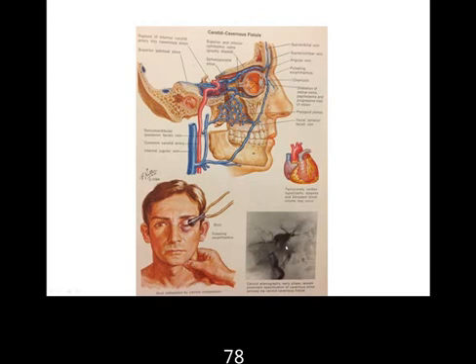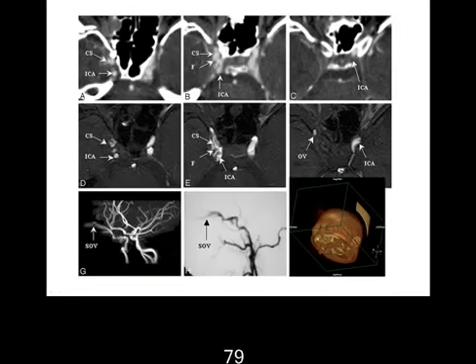And then this is an angiogram where we later put a coil in there and stopped the arterial blood flow to the vein. This is an MRI study. This is the nose, this is the back, this is the right side, this is the left side. We're cutting the patient's head, the top of the head is inside the screen, and the foot is towards us. Basically, the ICA is showing the fistula here. The artery is flying through this little neck into the vein, and the vein is draining towards the eye, which is here.